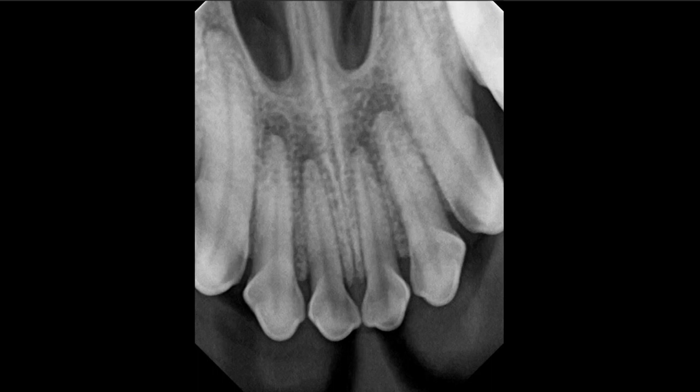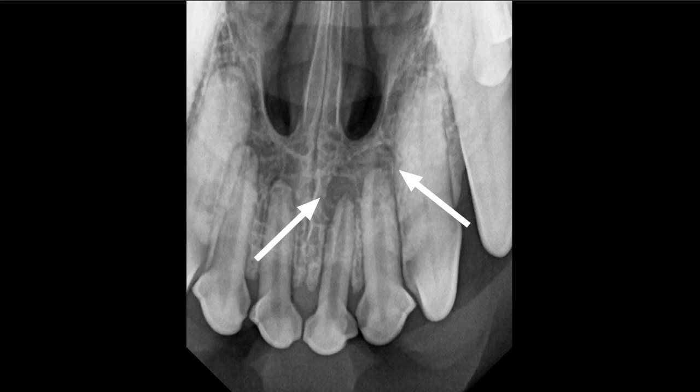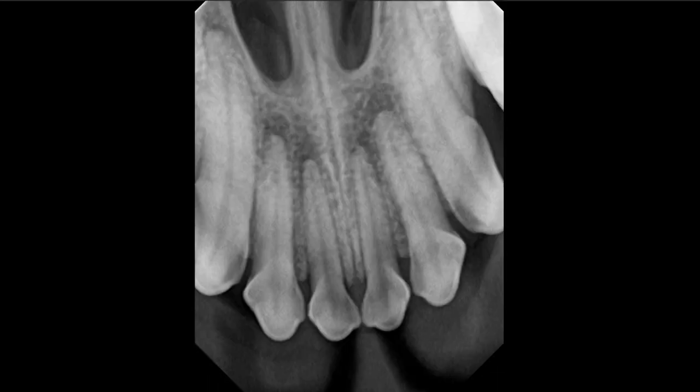Now, you cannot read in those lucencies like we see here into maxillary incisors on a consistent basis, because we see a lot of the chevron sign or a lot of lucencies around normal incisors too. So you have to be really careful in interpreting those changes. And if there's any question, you need to get the patient back, reevaluate radiographically in 6 to 10 to 12 months to see if those changes are progressing, if there's any question.